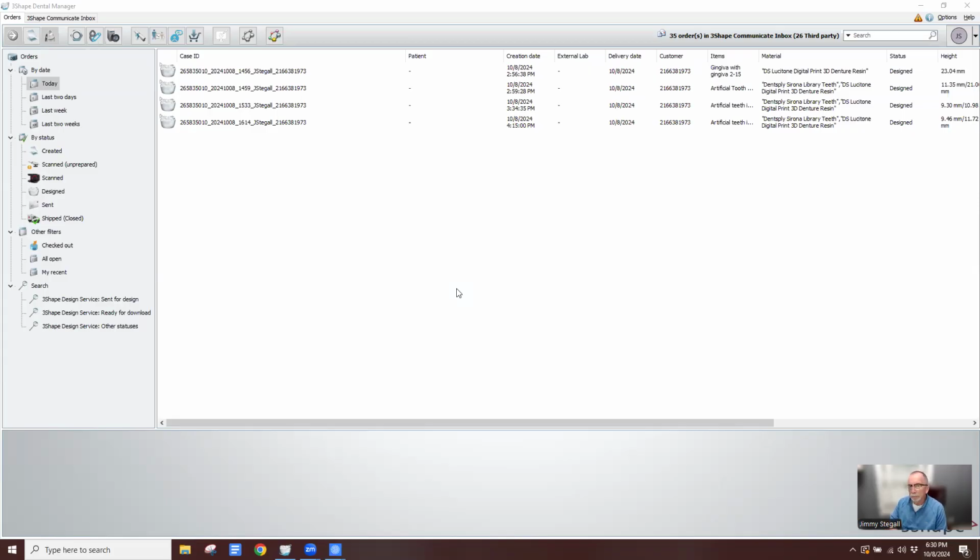So tonight, I want to finish up with three of what you could call more advanced workflows, but common questions I get on these three workflows a lot. They're all relatively simple, but I'll go through a case for each one and hang around at the end if we have any questions about any of the three. We'll certainly answer them for you.